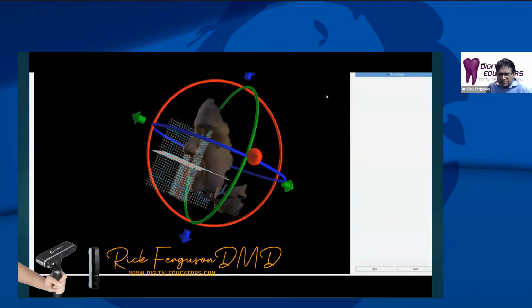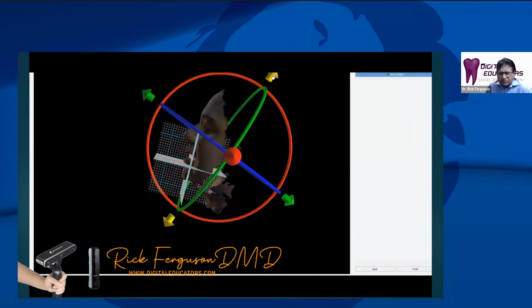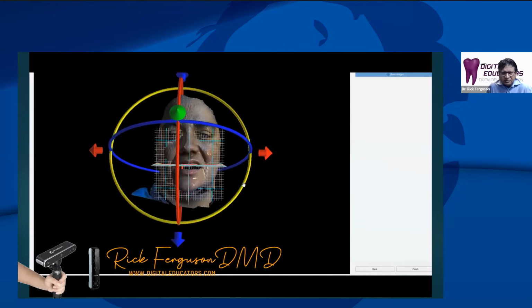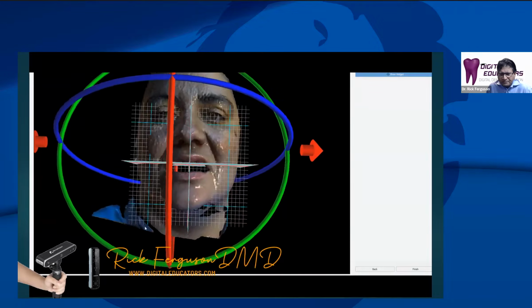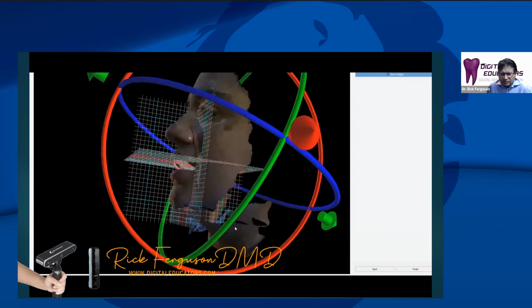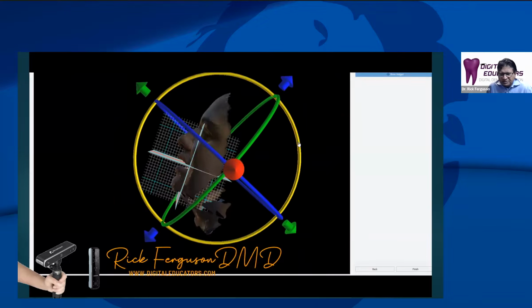And this is using the denture alignment functionality that you would use for your record bases. But here we're just using the face scan instead of the record base. But we're using this to align to the grid. I mean, you don't have to necessarily do this, but I find it helps, especially later on when we bring other images in, such as CBCT and so on.